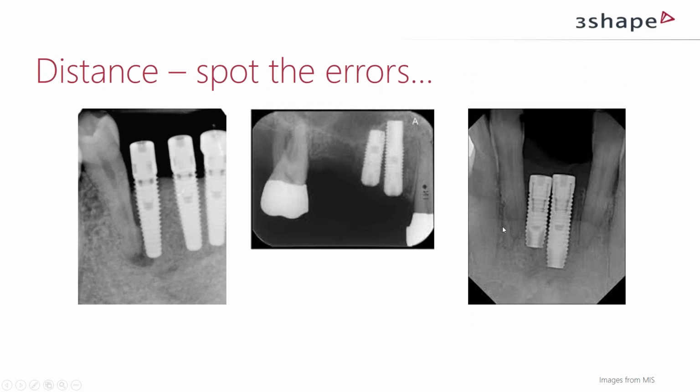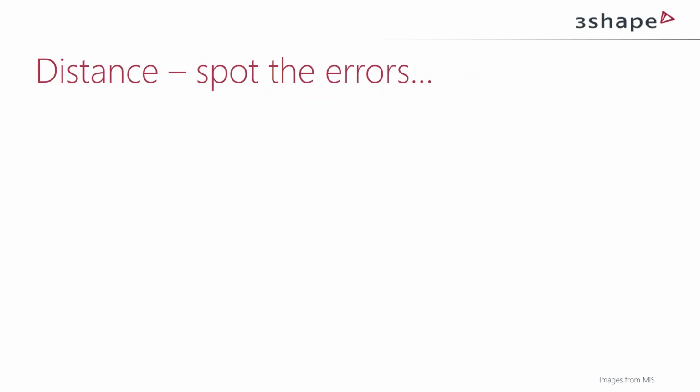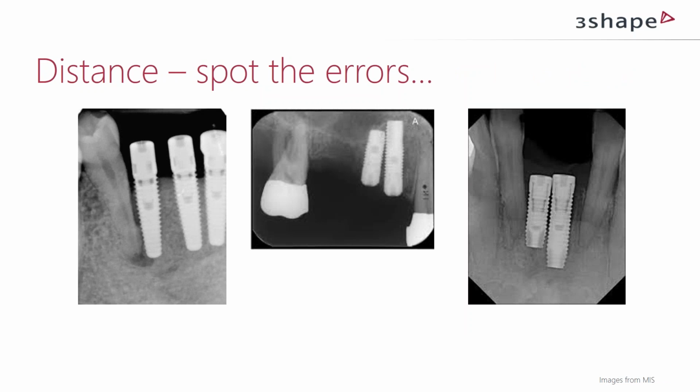This is actually interesting. Now we've talked a little bit about the shape and size of different implants, and merging that with the position considerations.